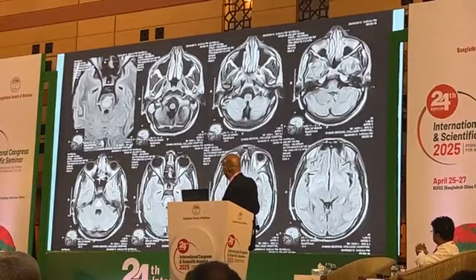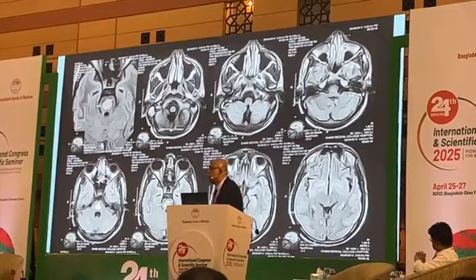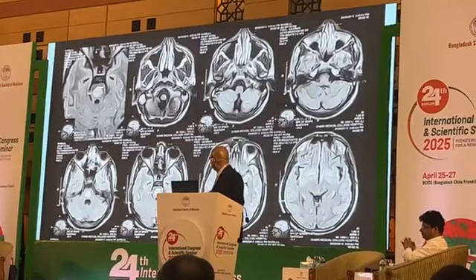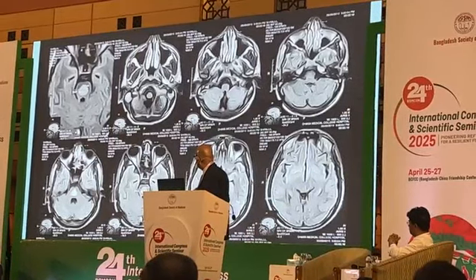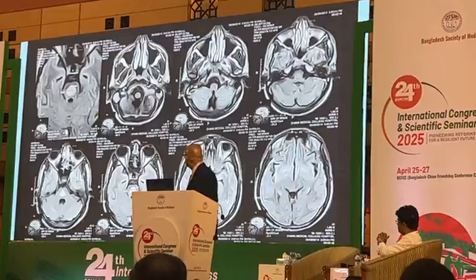This is central pontine myelinolysis. A classic lesion in osmotic demyelination syndrome, from sudden correction of sodium and all. A white lesion in T2 and FLAIR sequence, and black in T1, in the center of the pons. Patient presents with quadriparesis.